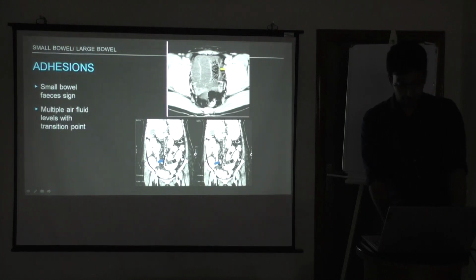Beyond this level you can't see this bowel. Contrast is nicely flowing till here, but here it disappeared. So that indicates that is the transition point. Most often it could be some small band or adhesion to the previous surgical site.